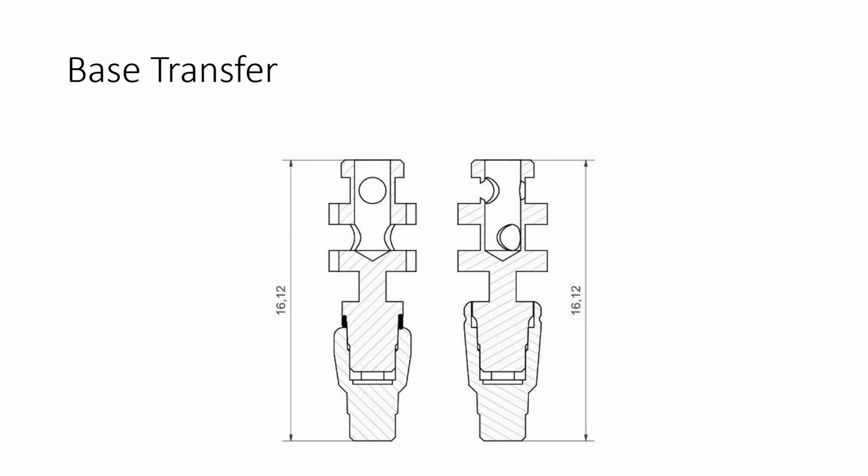So if the technician wants to use a shorter transfer base because it helps in the production of the analog model, he can do so without worrying that the position of the analog in the model will not relate to the position of the implant's vertical dimension within the patient, because as I say, the transfer bases have been designed to accommodate this vertical discrepancy.